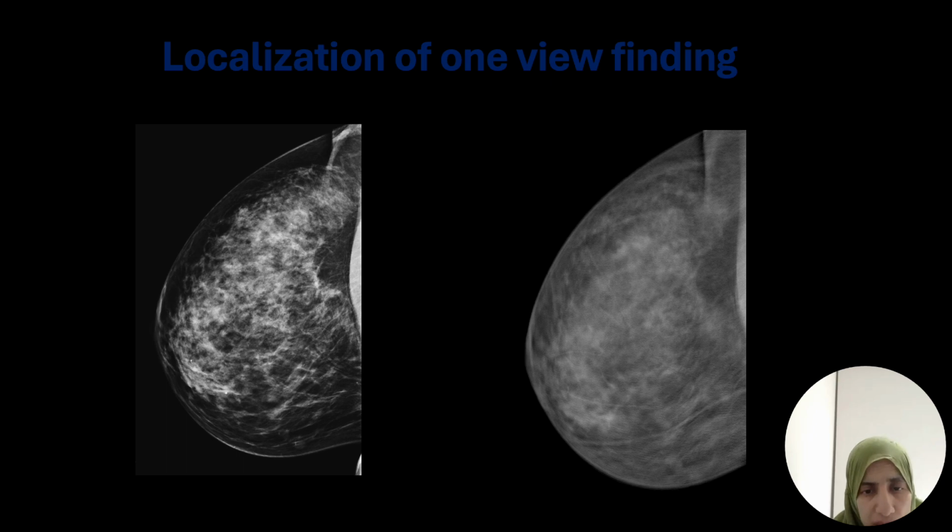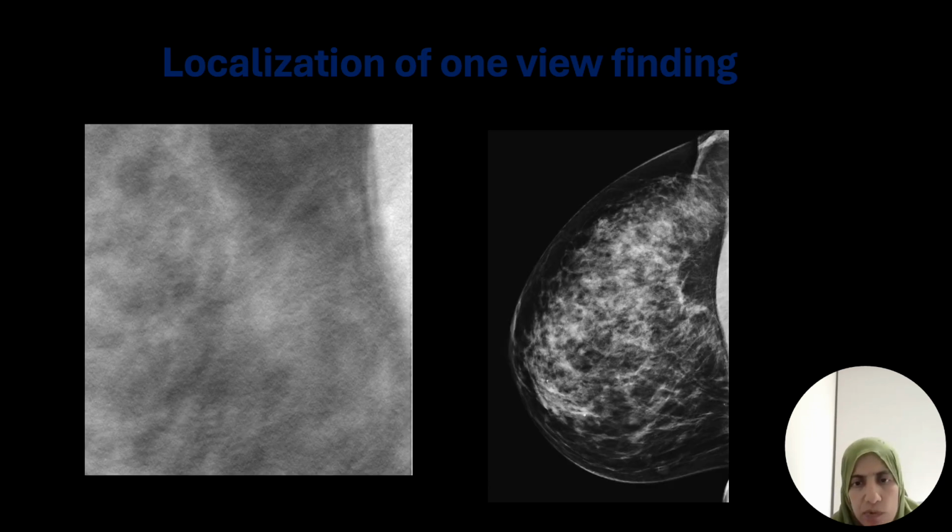And then another one, you see that this patient has an abnormality, which is here. You don't see much on the MLO view, but with the tomosynthesis, you would see now, it would be so conspicuous, and you can tell where it is on the lateral breast or medial breast. And as you scroll, you feel very happy seeing that, oh my God, it's so obvious, and you barely see it here. You could see the lesion is here, and it's a BI-RADS 5 lesion as well. And here is just a closer spot tomosynthesis image to show you how conspicuous the lesion is when you see the details of this lesion as well. It helps you to decide about the BI-RADS category of these lesions.